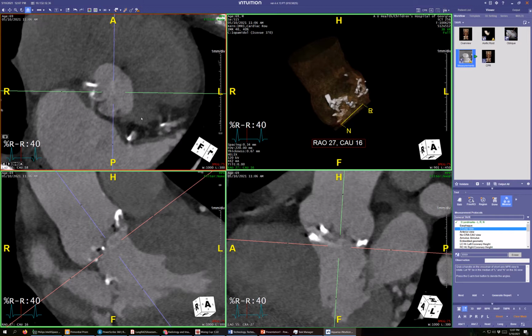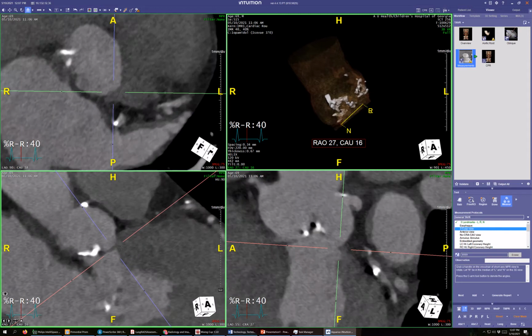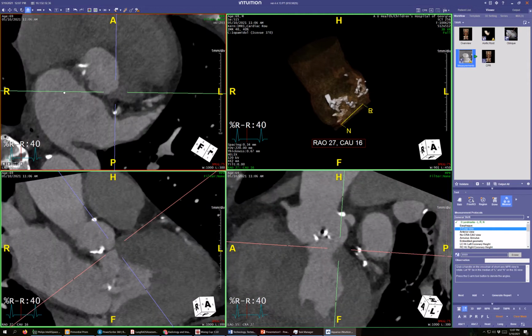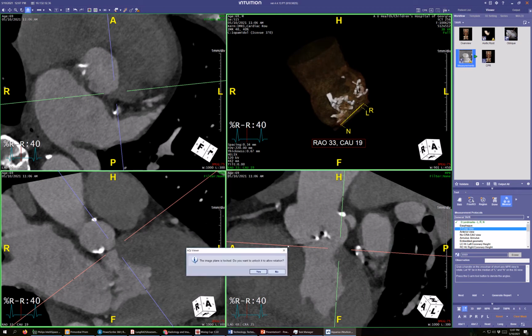So, you know, I'm going to go back and just quickly fix it. Oh, I was hitting the wrong key there. So anyway, there's our left, right? I mean, correct. And from there, yeah, I want to unlock it.